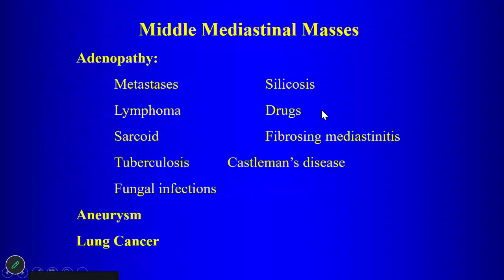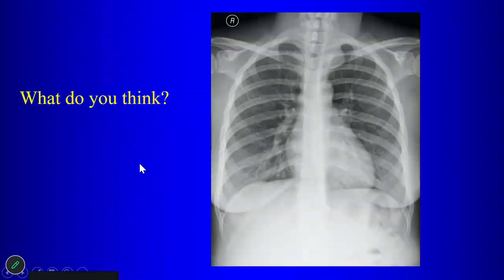Okay. Now, as we move on to the posterior mediastinum, where is the mass and how do we know it's in the posterior mediastinum? There's a cervicothoracic sign. Yeah, so I have a nice cervicothoracic sign here. How do we know that's posterior? Because it interfaces with air. You can see the lateral border above the clavicle, so that is a cervicothoracic sign.